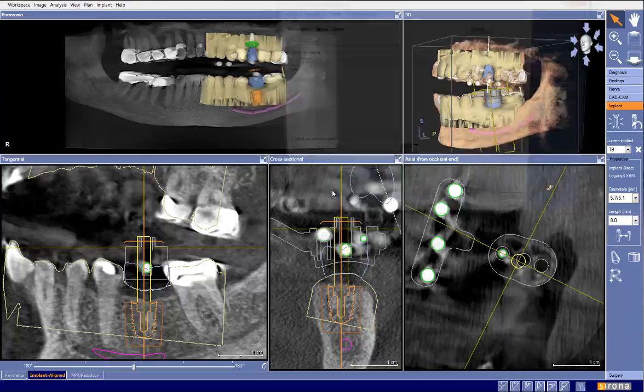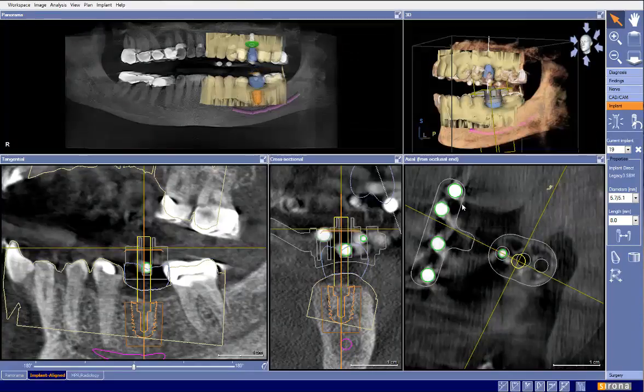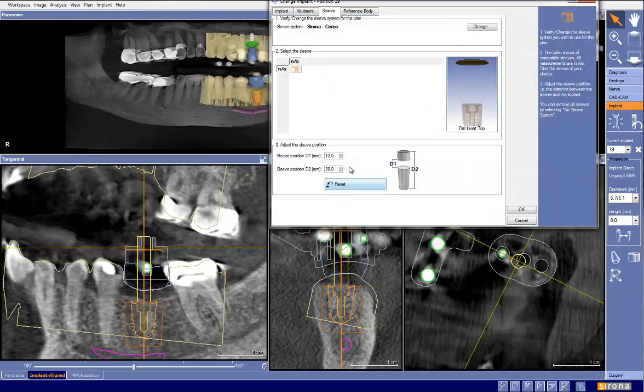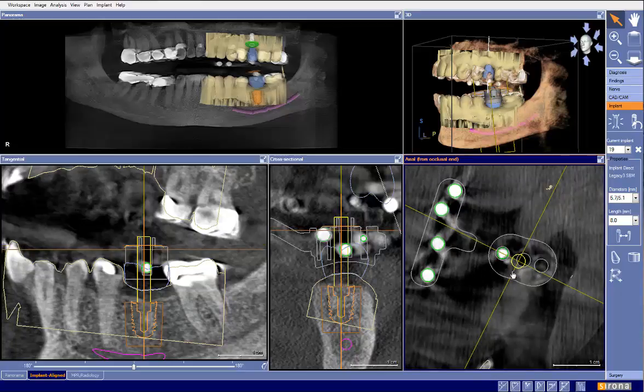And 22 is going to be good enough to get us above. We could possibly even go to 20. 20 is cutting it close, and I don't like to cut it close, so I'll just go to 21. And 21 will get us there. So now the height from the top of our key to this is 21. That's our length there. So from this point, this CEREC guide is done. And looking at it, we can see that we're within the realm here. The software will mill this at an angle and get it done.